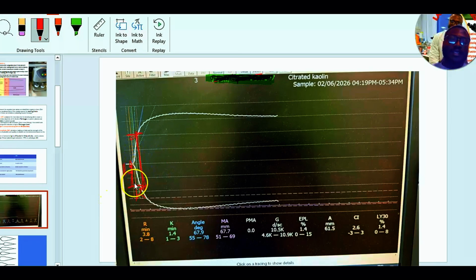So now, if you look at the kinetic time carefully, the contributing factor is not the clotting factors, because once a clot begins here, the rest is your fibrin strands that are going to extend, accumulate platelets into it to form a mass. So the whole kinetic time is contributed by your fibrinogen, and also if you've got enough platelets. Because if you don't have enough platelets, even though your fibrinogen is able to interconnect, it can't incorporate more platelets into it. So the amount of platelets is key, as well as your fibrinogen availability, its amount and its quality, which is what makes the kinetic time.